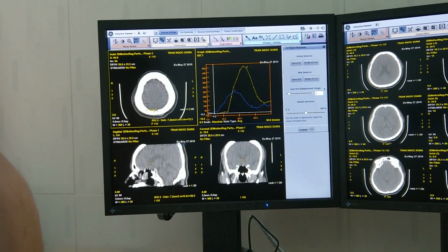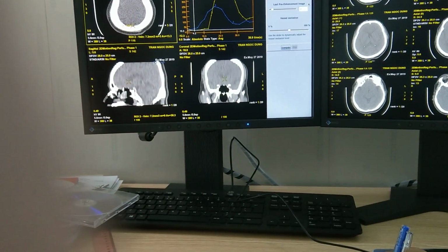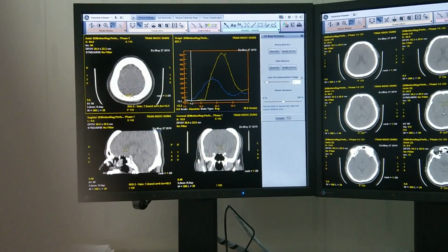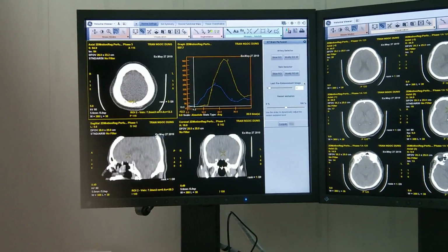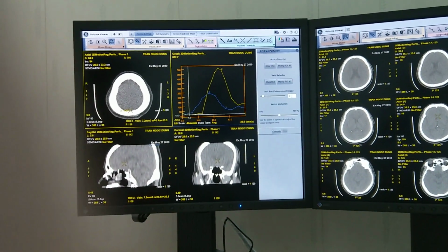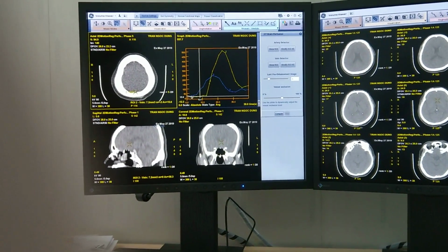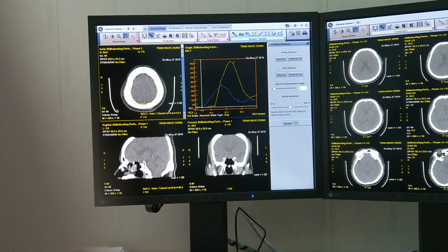Okay. This one. So this is the image. This one. You see, this is 1, 2, 3. Number 3. So just before it go up, where the blood arrive, the first image blood arrive. So you put here. If you put 4, this one not accurate. You want the baseline here. Do you understand? Yes. Okay.